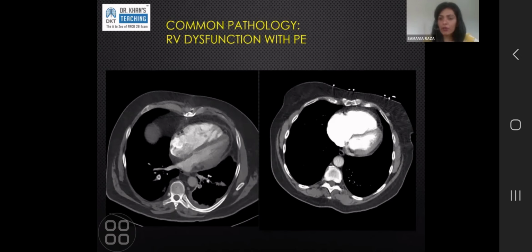When it's just subtle straightening, or what you have convinced yourself is subtle straightening, I'm sure most of you will say, I think this is subtle straightening. If you put that into the cardiac views I told you about, into a 4 chamber and then turn that into a 2 chamber, so you could see the LV rounded and the RV next to it, you would be able to see that this is not actually straightened.